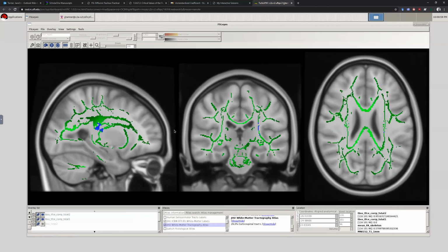And then we'll end with that, but hopefully that gives you a sense of tract-based spatial statistics. This is a really powerful tool, with the caveat that most of the analyses that we're doing, or this analysis, is FA, and so it's based off of what we call diffusion tensor imaging. It's an overly simplistic view of the brain. It's shown to be clinically important, but it's not a perfect value to use. But we can go on and use some other diffusion-based values. That's well beyond the scope of this class. And then with that, we will end this presentation.